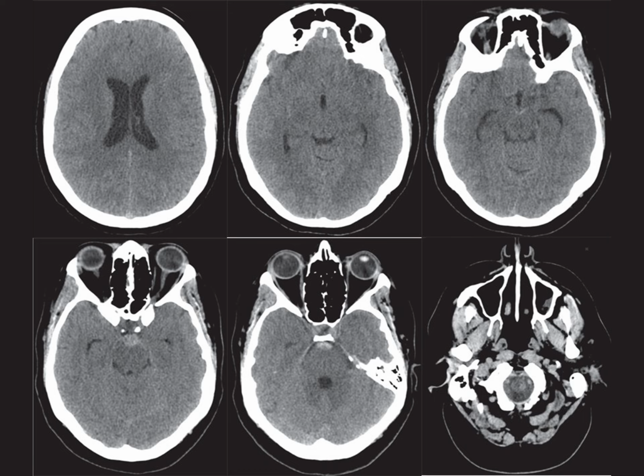In my routine clinical practice, when faced with such findings, I would closely scrutinize other images in the series, including those using both brain and bone windows. This helps in looking for hemorrhage elsewhere or evidence of trauma, like a calvarial fracture. If the patient is still on the CT table, immediate CT angiography would be considered to look for an intracranial aneurysm. It's crucial to discuss such cases urgently with the referring clinical team and consider getting a neurosurgical opinion.